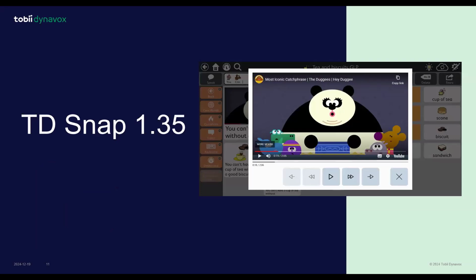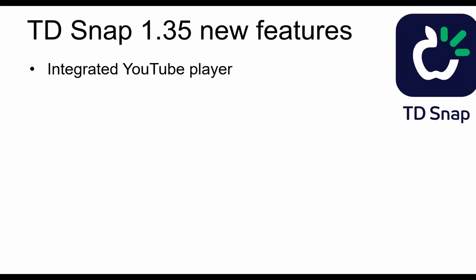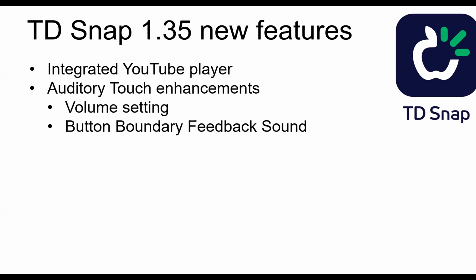So this is what we're here to talk about, though: TD Snap version 1.35. The big part of it, and what we're going to be spending the most time on, is the integrated YouTube player, but it's worth drawing your attention to some of the other functions. We have new features for people who are using auditory touch as an access method. Auditory touch is perhaps for a visually impaired person who can rest their finger on a button and slide across and listen to find the button that they want.